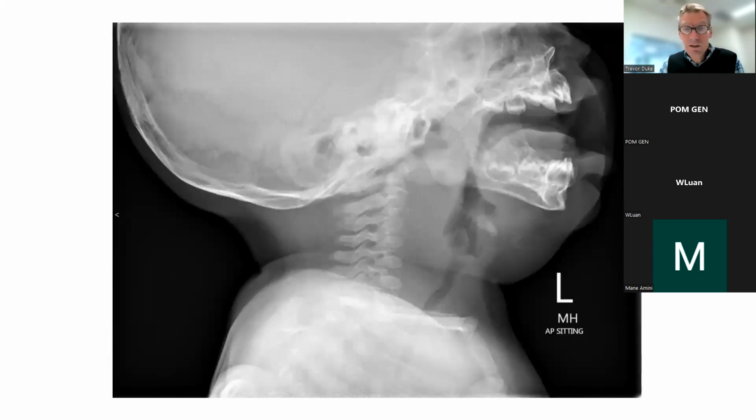Yeah. Okay, this is going a bit different now, and this was a child I saw just this week who came in with noisy breathing with stridor. There's one thing I wanted you to observe on this X-ray, that we're not used to looking at, lateral neck X-rays, but I just want you to see one aspect of it. What can you see?